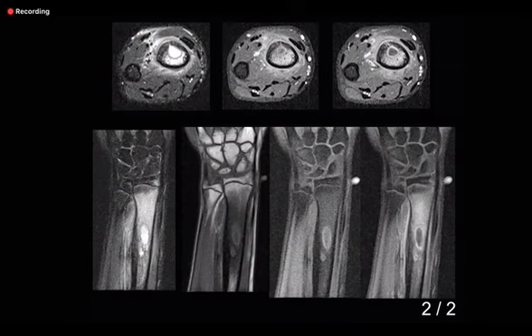Given these appearances, I think this patient may have an infective process. I would like to find out if the patient is septic or has any fever. So I think this may be an osteomyelitis, and I'll advise urgent referral to the orthopedic team if this has not already been done. Anything else in the differential? Malignancy will be there as well. I think Ewing's, but I don't see significant periosteal reaction, so I don't think this is a Ewing's sarcoma. It could be a Brodie's abscess, osteomyelitis.